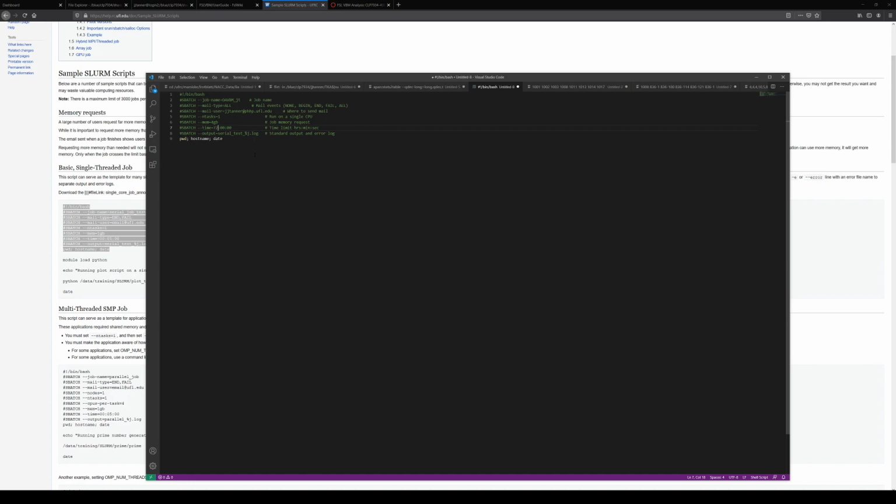I ran this locally on my computer and I think it only took about 24 hours. So really it shouldn't take that long to do, but I'd rather be safe than sorry. We can request more time. That's not really a problem. And then I'm just going to change this name for the log file, and then we keep those commands.